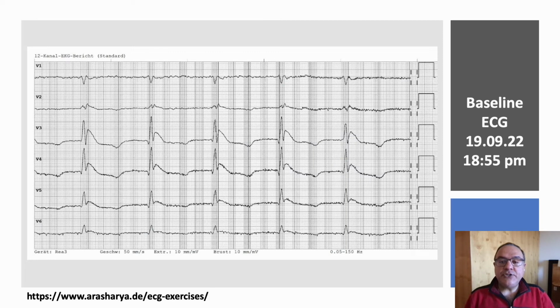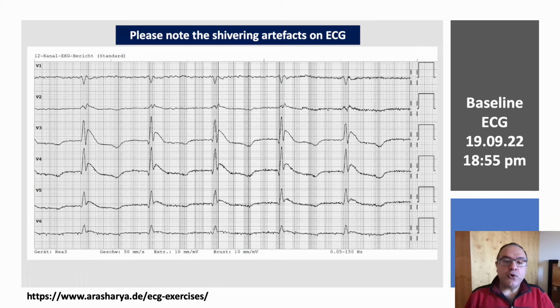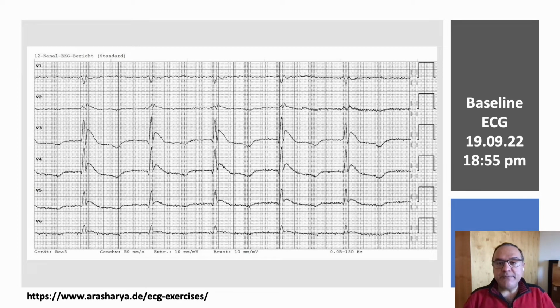This is the ECG on admission, which shows a typical presentation of Osborn wave, which we see in patients with hypothermia. The core body temperature at the time of admission was around 26 degrees centigrade. Actually, hypothermia is defined as core body temperature below 35 degrees centigrade. It is associated with some ECG changes.